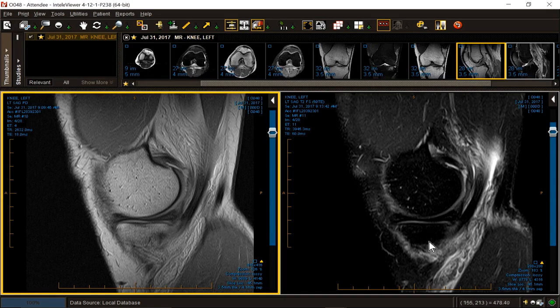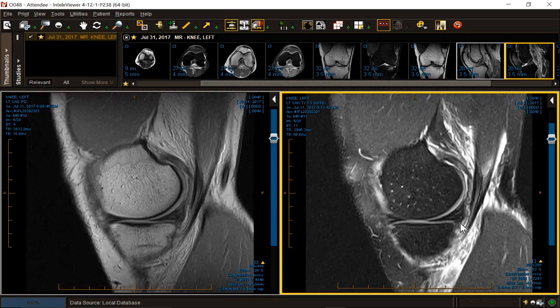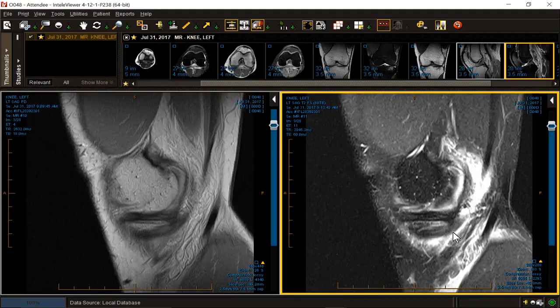Well, the main insertion of the semimembranosus is swollen, isn't it? It should be a nice, thick, black band. It's injured. What about our meniscocapsular reflection? Certainly not nearly as bad as any of the cases you've seen. Is it swollen? Yes. Can we see attachment fibers? Yes. So there's been a capsular sprain, but not a capsular rupture. There's been a posteromedial direct head of semimembranosus injury, but it is not detached.